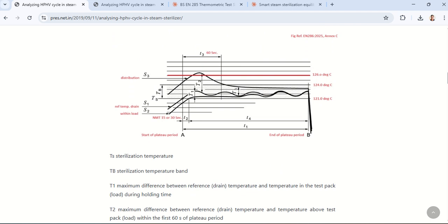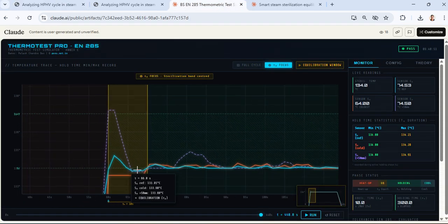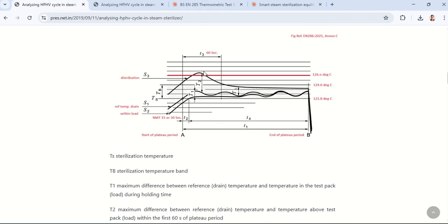Normally the program interface that you looked at in Cloudi is the actual representation of this chart. If you remember, I talked about T2, where we are zooming in our program. So this is T2 focus, we are zooming in. This T2 is nothing but this one.